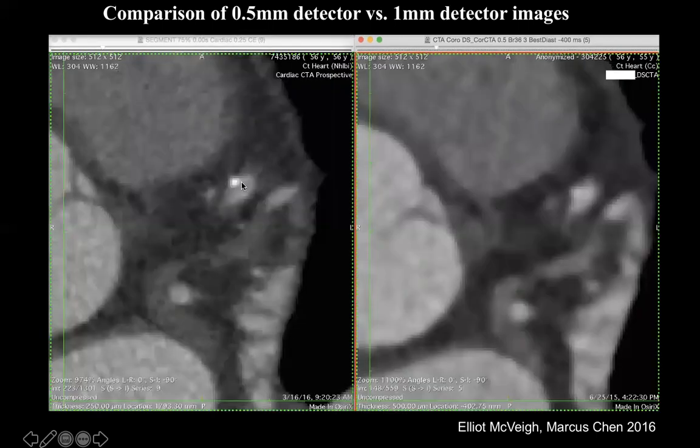And this is fantastic. This is like a 2x2, so it's probably a 1 millimeter piece of calcium on the high resolution scanner. And this is what it looked like on the standard scanner. Barely able to make it out. Probably would not trigger a positive call using the standard coronary calcium algorithm.